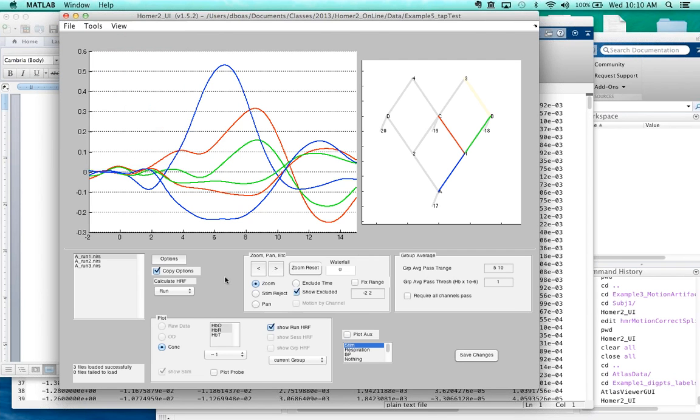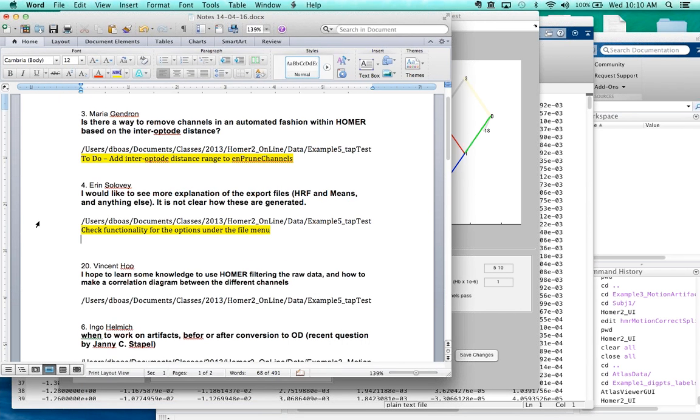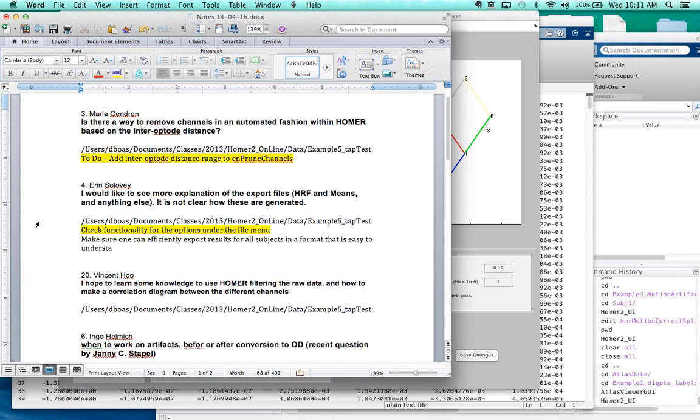Okay. Yeah, but for sure, if you do it by right clicking the traces, subject by subject, that will certainly work for you. Okay. Yeah, I didn't even know that was available. Okay. Super. Yeah, I'll make more notes about that. Right click, that'd be fine.